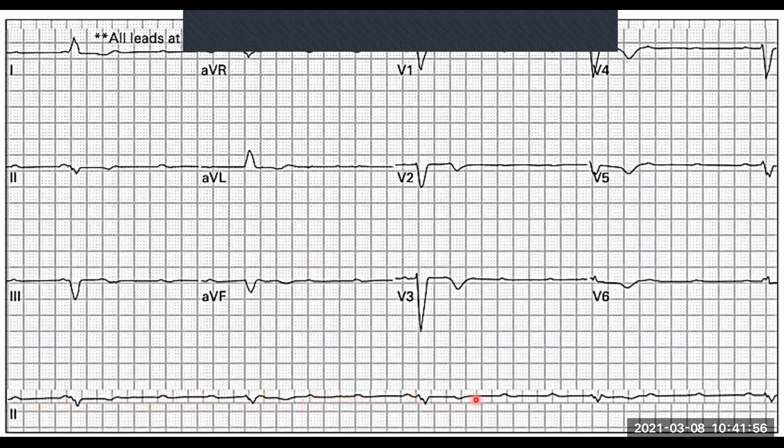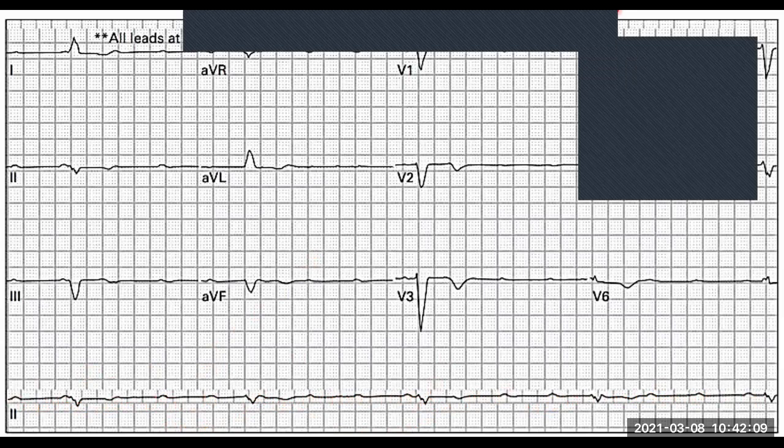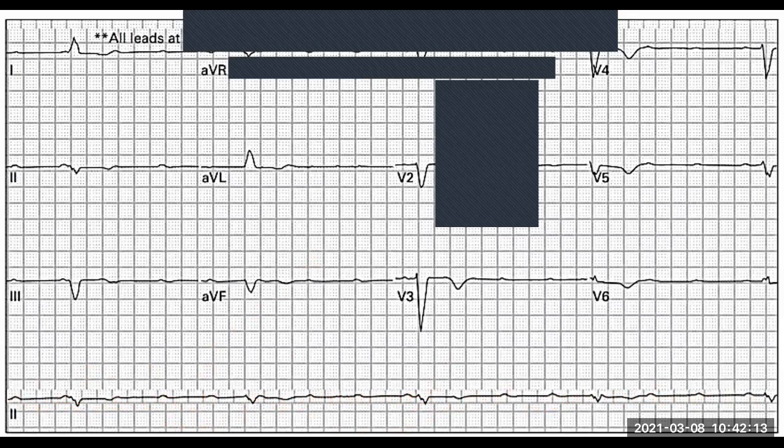In fact, they're about 3 blocks away from one another. So you've got this atrium that's going at about 100 beats per minute, and you've got this ventricle that's going at about 25 beats per minute. So I'm going to do what I did for the guys earlier, in that we're going to make a little drawing, just to demonstrate some things.